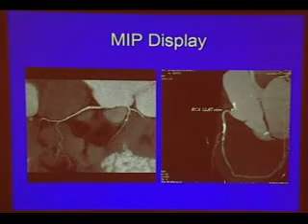These are just other means of seeing the coronary arteries, where we can just stretch out the vessels, something that you can't really do with a catheter angiogram. We can stretch out the vessels and see the vessel in its entirety. You can see little specks of calcium here and there. This patient doesn't have any significant severe disease, but at least we can tell the patient, you already have some disease. It's best to start taking care of yourself now. Let's take some medications to prevent increased cholesterol, etc.